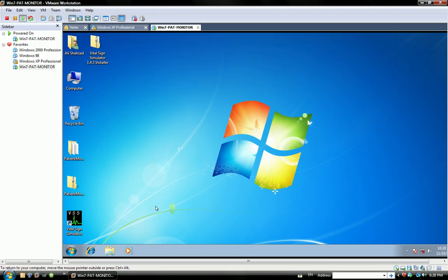Now, when you download the software and run it, you will have this file normally stored on your desktop by default. It's not in the download folder, or your pictures or music folder; it's only stored on your desktop. When you click on this file, it will bring up the operator window as well as the training window. Then you will activate all of the parameters and value checks which are important for displaying a patient monitor.